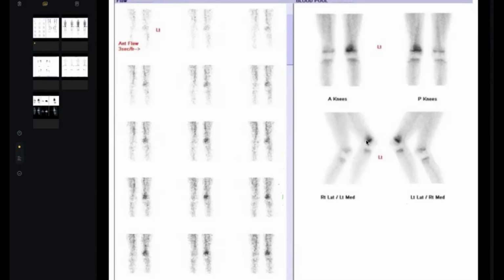So our doctor said that we see a lesion here that shows uptake in all phases. This is dynamic. Why? Because he gave us timing, and there are multiple images. Very easy. So this is a dynamic bone scan. When you see a dynamic bone scan, put in your mind one of two diagnoses: either osteomyelitis or what is the second one, my doctor?